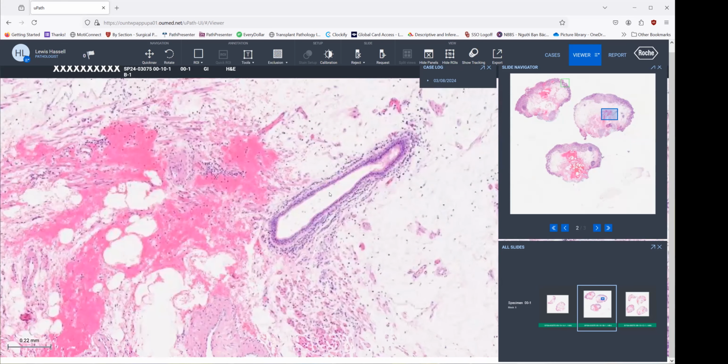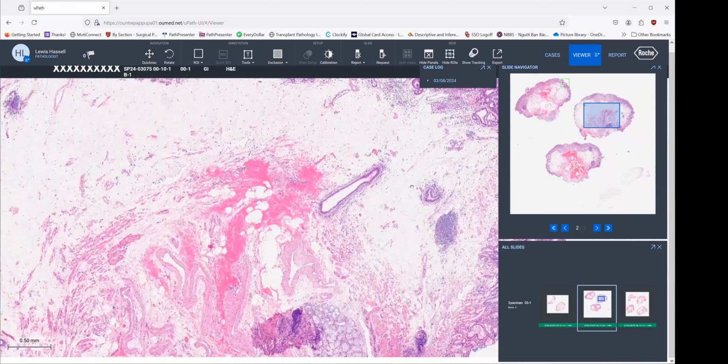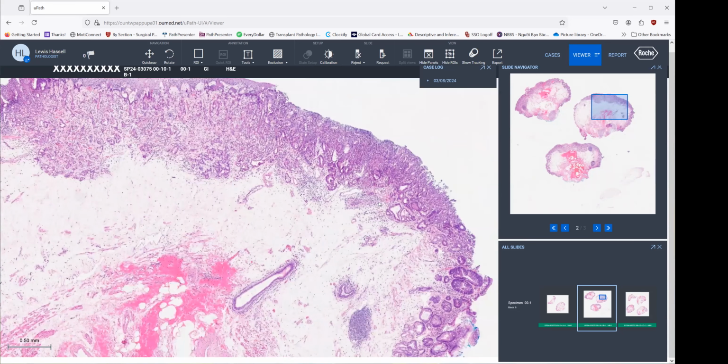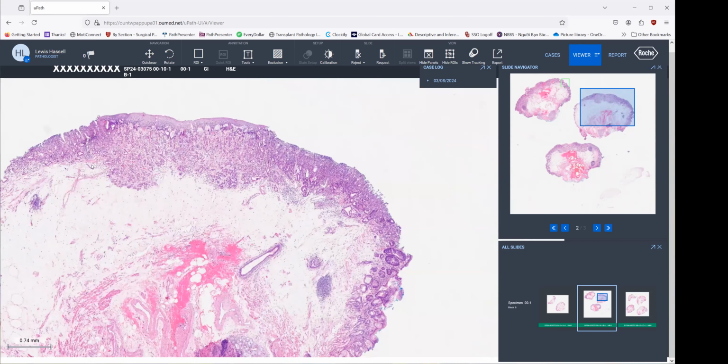Sometimes this duct can be lined by squamous or slightly stratified squamo-columnar mucosa and is not neoplastic. What we can also see, however, in this particular case, is that here there is an evident mass lesion. The mucosa is busier up here, and then we have this beginning of an indentation into the lamina propria.